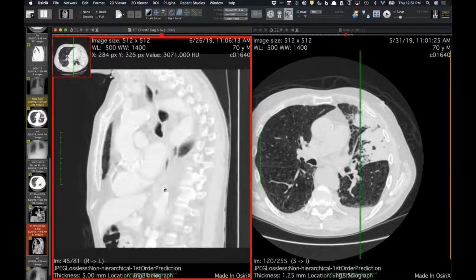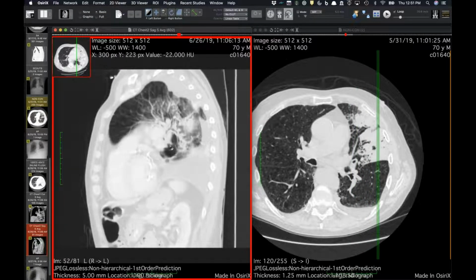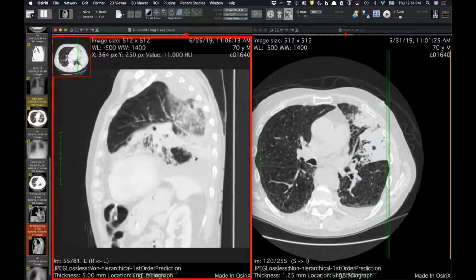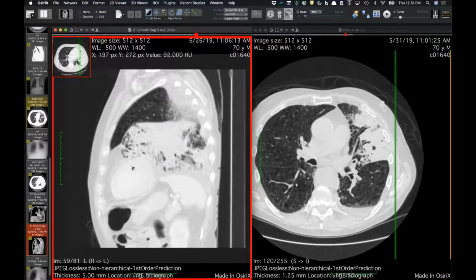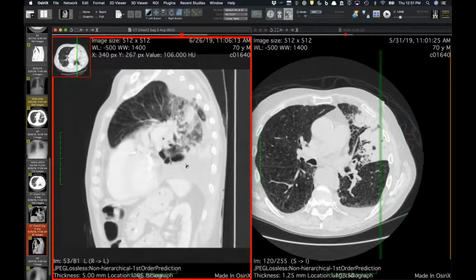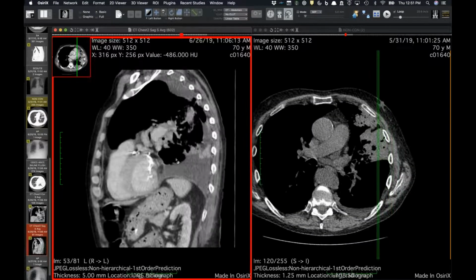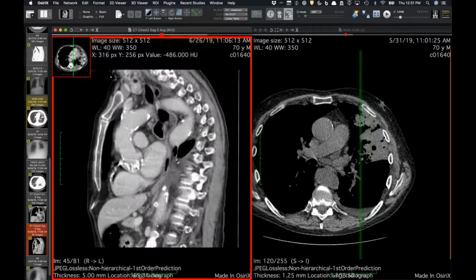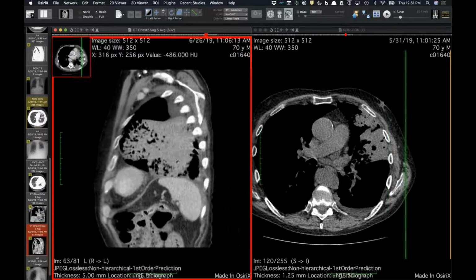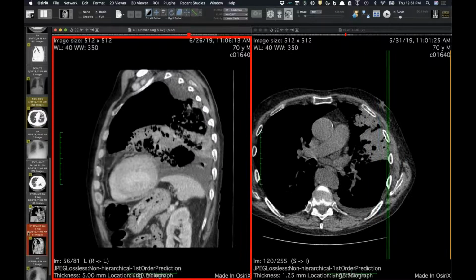And you can see the swirling as we move across here, where the left upper lobe has now torsed anteriorly and down. I guess that's a counterclockwise rotation when you're looking at it like this. And you can see the swirling both on the lung and the soft tissue windows. So spontaneous torsion secondary to pneumonia, just weighting down the lung and causing it to flip.